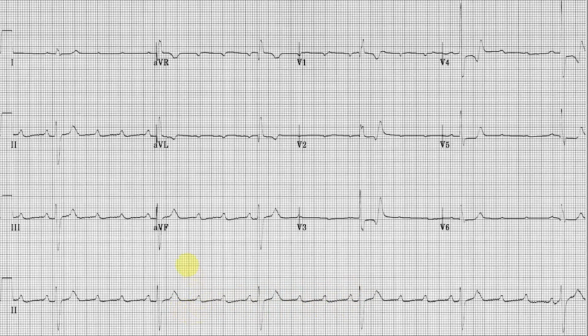Let me talk you through the usual stuff at first. The atrial rate in this ECG is 150 beats per minute and regular. The ventricular rate is 36 beats per minute and regular. For every 4 P waves, there is one P wave which is followed by a QRS complex. In other words, there are intermittent non-conducted P waves, which makes me wonder if it is a second-degree heart block. The QRS complexes are narrow and regular. There is some subtle right bundle branch morphology of the QRS complexes. Now, the axis of the QRS complexes is about -60 degrees. In other words, there is a left axis deviation.